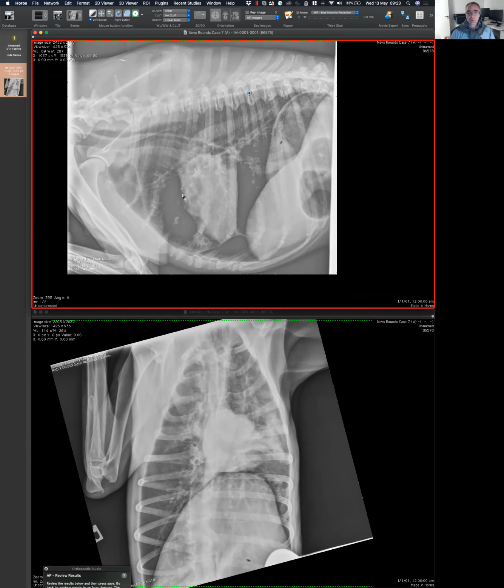So I'm going to argue with myself and say, if that is so much, I'm going to argue against the pneumothorax. What I'm missing in this case is the border of the lung. Makes sense? Because we should see that separation of the lung from the wall, and we should see that border of the lung. And even if it's hard, probably you can still see little vessels here. That shape, based on that direction, could never be a lung that is separated a little bit one way and nothing the other way. The lung doesn't do that because it always separates towards the hilus, away from the wall. So missing little vessels here and not being able to see the contour of the lung, I think it goes against pneumothorax.